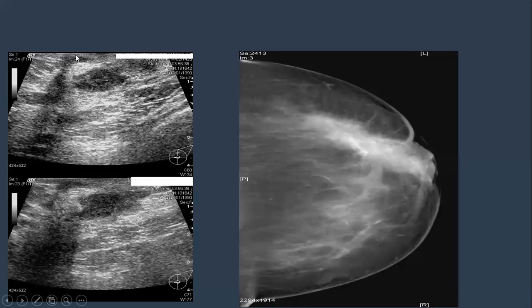This is the nipple, and this is the areolar skin laterally. This tract is coming, tethering and causing retraction, puckering retractions by pulling and adjacent thickening.